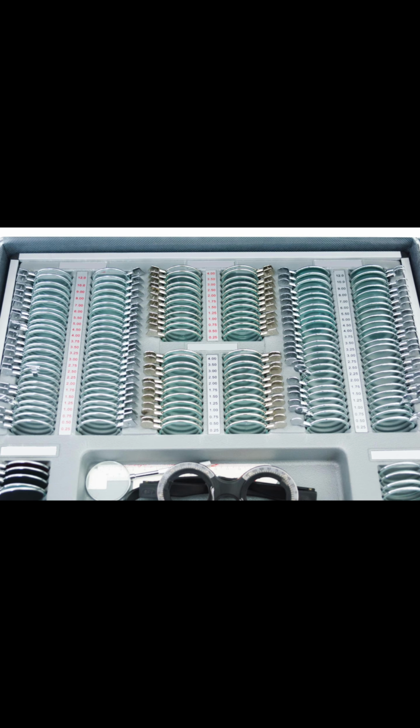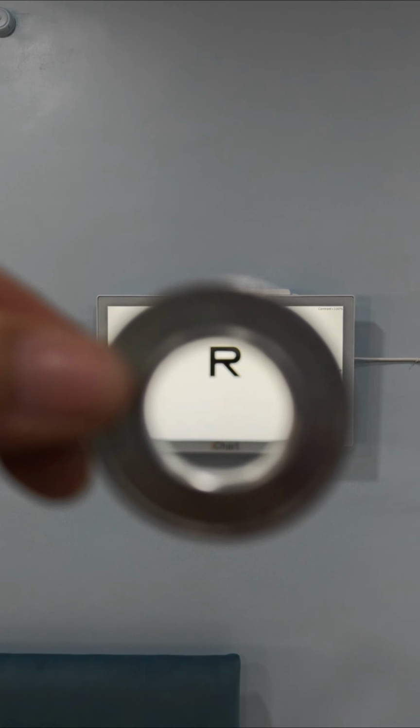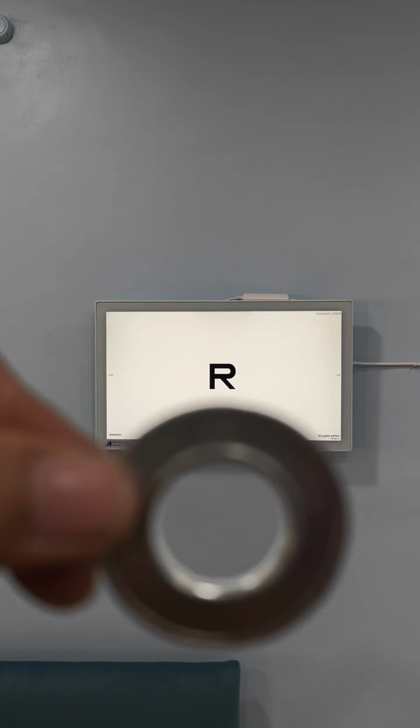So today we are going to deal with identification of convex, concave and cylindrical lenses for your ophthalmology viva. To identify these lenses, you take the lens, hold it at an arm's length and look at a target object through it. Now observe two things, the most obvious being the size of the image. In this case, you can see that the image looks magnified. So this is your first clue to correct identification of the lens.